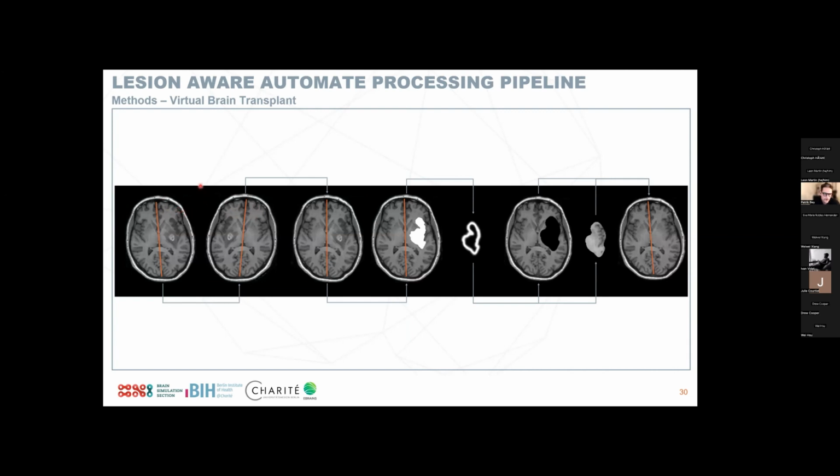And then we cut this warp in half and say only give us half of the transformation. So going from left tilted to right tilted, and half of this is basically perfectly midline aligned. And then we see this midline aligned image. And then we can use the idea of actually just swapping alongside this axis and get the same area.